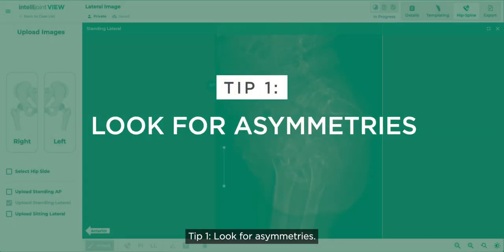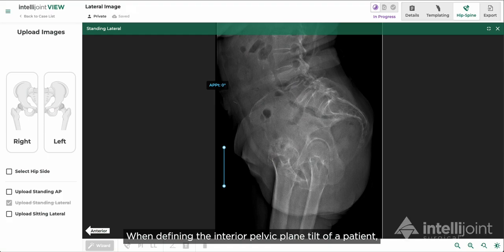Look for asymmetries. When defining the anterior pelvic plane tilt of a patient, it is critical to bisect the anterior superior iliac spines. Although they will sometimes be perfectly symmetrical, it is much more likely that there will be some axial rotation. You should look for asymmetries. If you can see two distinct acetabula, there is axial rotation in your image, and you should also be looking for two distinct ASIS points.